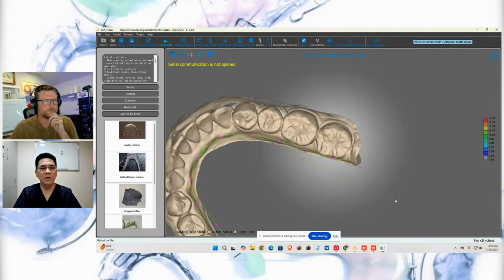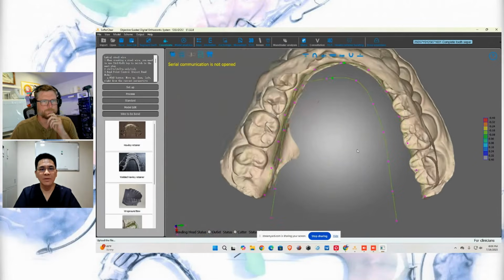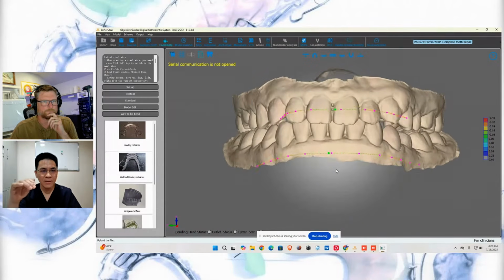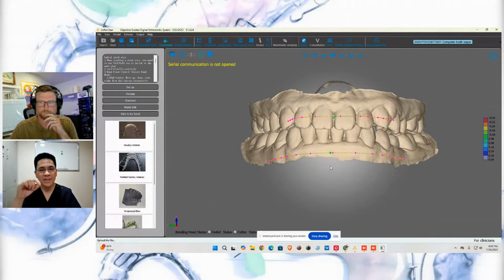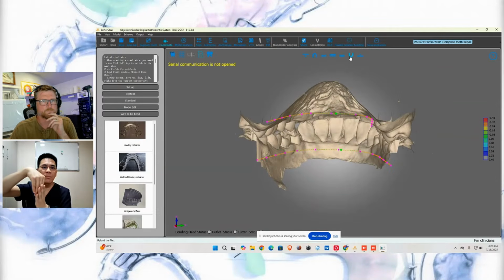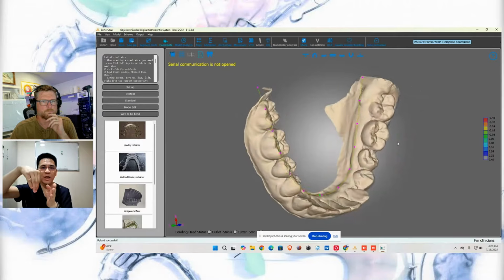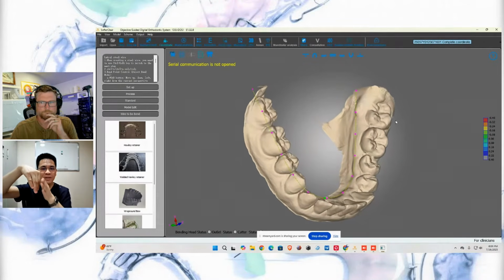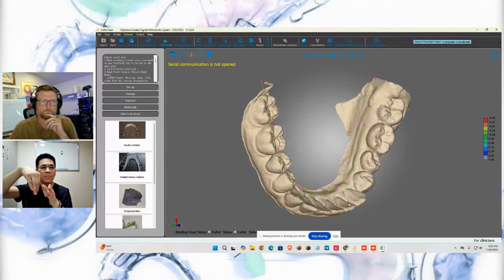Oh, and we're here. We're in the wire bending area. Yes. So before we begin the wire design, we first do the undercut, because especially for the lower model, we usually have the undercut in the gum. So if you do the undercut, the wires will automatically set the distance to the gum.